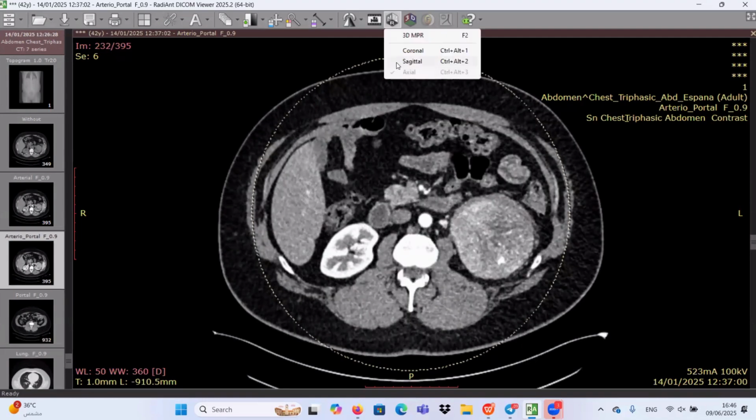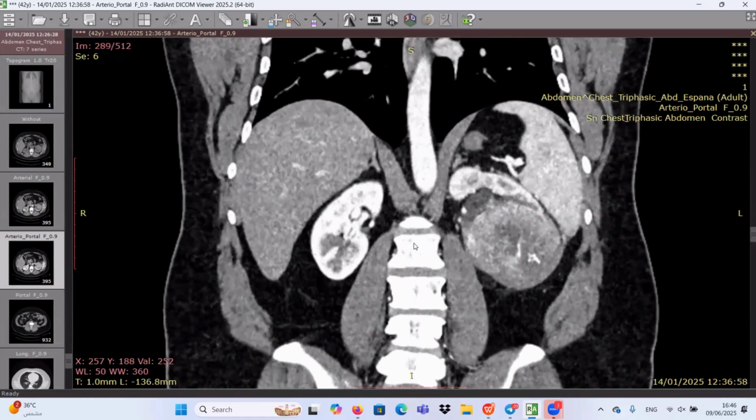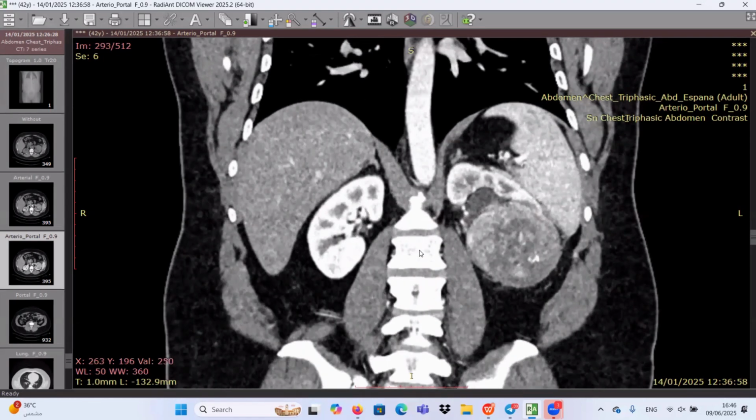I would like to add something very important in any case of renal cell carcinoma. This is the claw sign, indicating that the mass is arising from the lower pole. If you want to describe any mass in the kidney, we have 2 lines mainly: this one is the superior polar line, and this one is the inferior polar line. They are present at the entry of the renal sinus. So we have 2 lines and 3 spaces: upper pole, lower pole, and interpolar component.